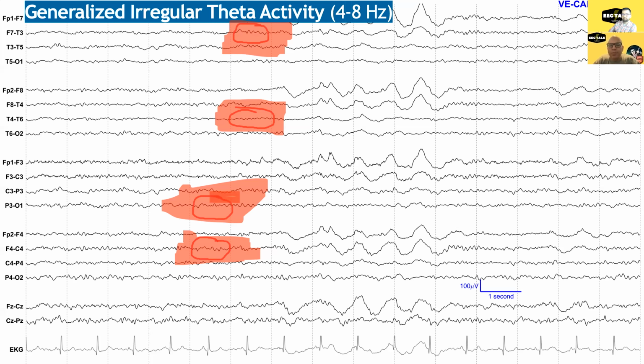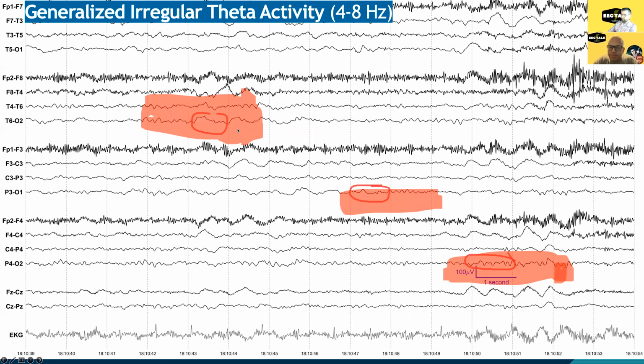Another theta example to look at. So let's do this one here. 1, 2, 3, 4, 5, 6, 6-ish, 7. I think so. Yep. So there you can count 7. 1, 2, 3, 4, 5, 6, 7. I get 7, so maybe 7.5. And then up on the upper one, there's a circled area around what looks like 1, 2, maybe 3 waves, 2 or 3.